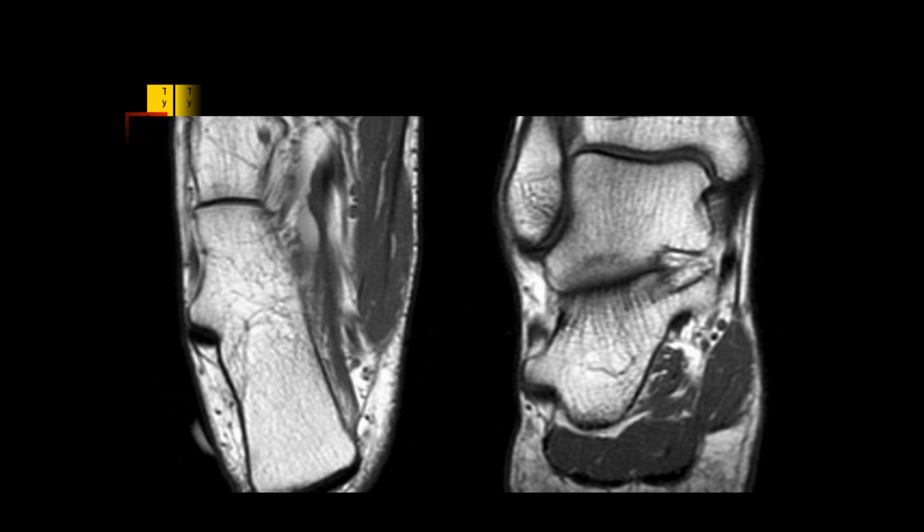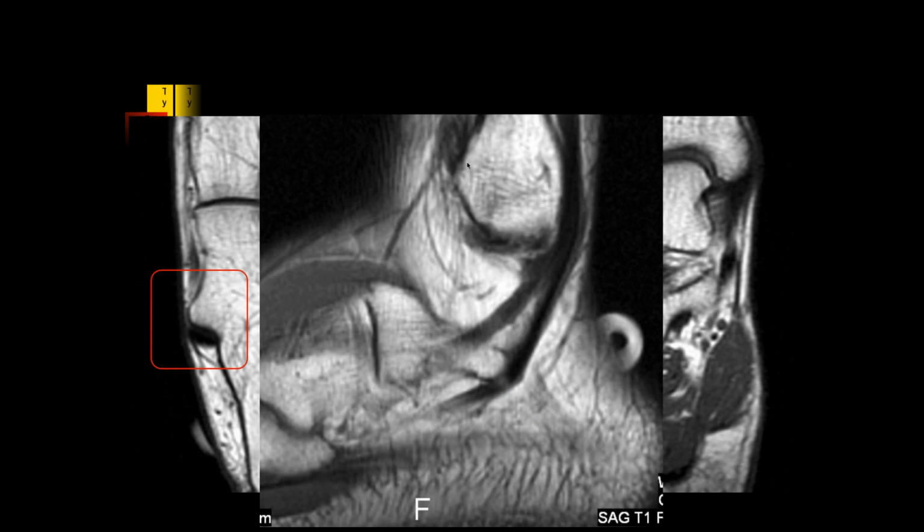Okay, so on the first image, axial through the calcaneus, we see this prominent bony protuberance. And it looks like the peroneus brevis is probably anterior to it, and the peroneus longus is posterior, so peroneal tubercle. And here's a sagittal. You can see on the sagittals that it's definitely splitting the longus and brevis, so it's consistent with the peroneal tubercle.